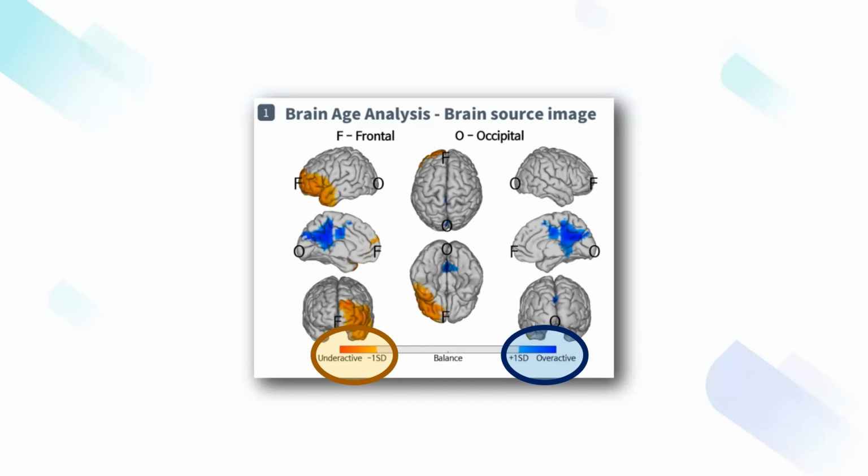If you have a lot of underactivity in your brain, that can be a sign of attentional issues like ADHD. It can also have to do with different sorts of learning disabilities, if that part of your brain has to do with some learning tasks. We also see a lot of slow activity in head injuries because during a head injury like a TBI, a lot of neurons die, so there's less firing going on there, less beta activity, and you might see a big orange splotch.